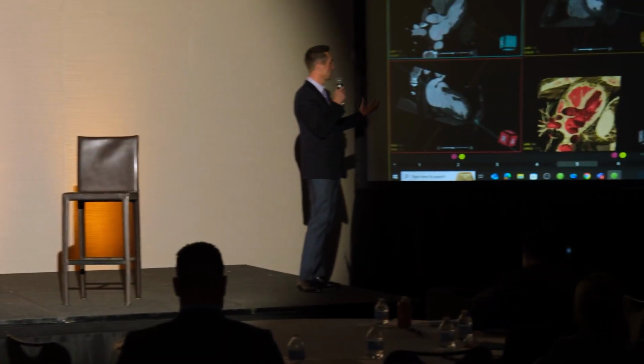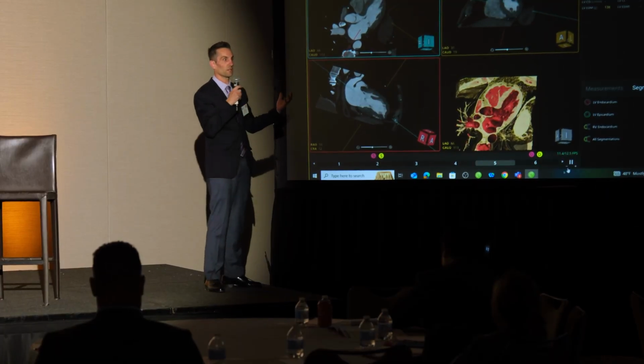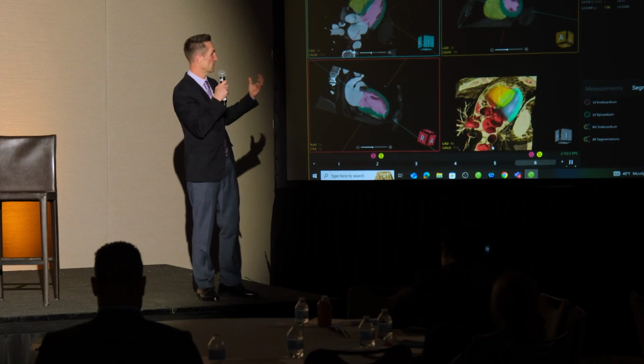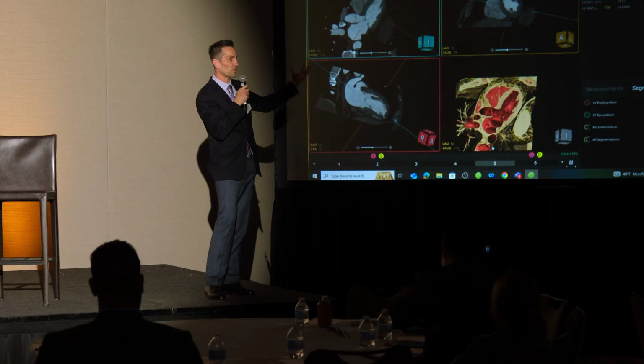Patrick, can you put that up again and show? I think that's some of the most powerful stuff, being able to see how easily... And show the function. Yeah, do we have some of the function as well? Circle's been in this space for such a long time and has gotten so good with the data through the gold standard, which is MRI.